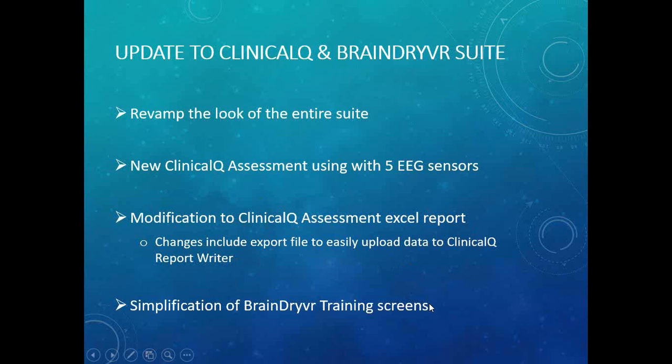Another key feature is that we've simplified the BrainDryvr training screens. A lot of people gave us some feedback, or flak I was going to say, about the training aspect. They thought there were too many screens, too many ways of visualizing the feedback for certain statistics. So I've removed about 40% of the screens. Still a whole bunch, and there's still a lot of possibilities, but I've made it simpler by taking away some options that I know people were not fans of, and I've modified a lot of the screens that remain to make them easier to understand, easier to work with, and easier to look at. That's something we'll be looking at again today.